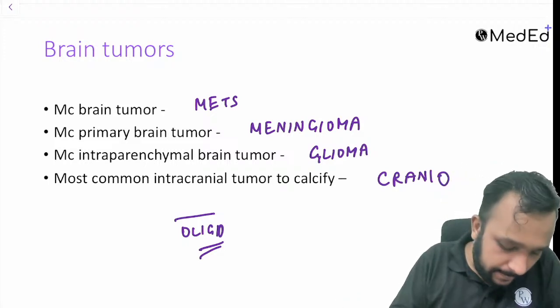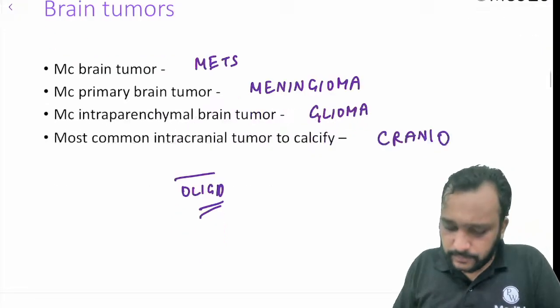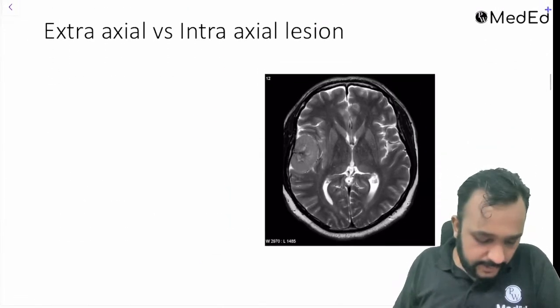Is that clear? Now guys, moving on to the next image.